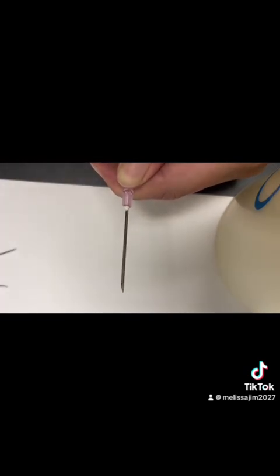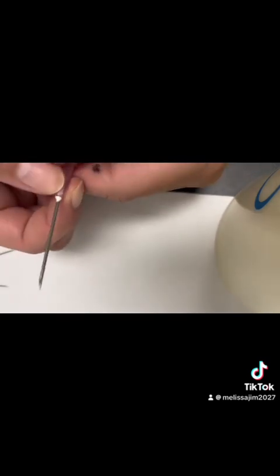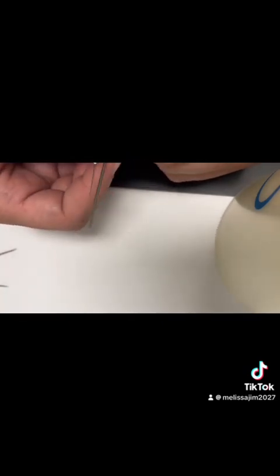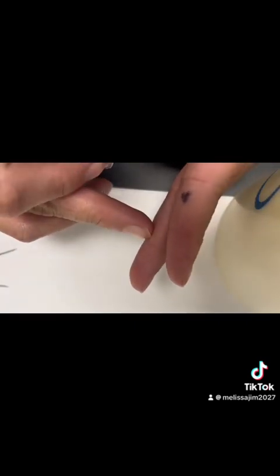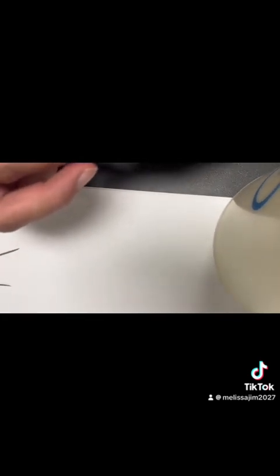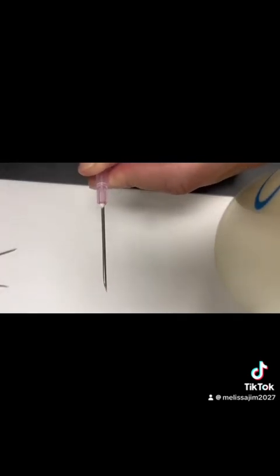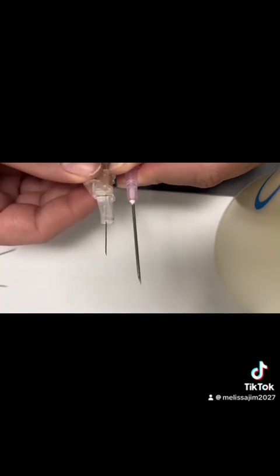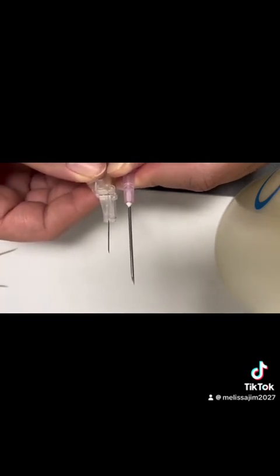And again, how you're going to know which type or which size needle to select is going to be based off the purpose of the injection. So why are you giving it? Are you giving it for an IM? Are you giving it subcutaneous, intradermal? And we're also going to base it off the size of our patient. If we're giving an IM injection, we would choose different sizes, say for like a John Cena sized man, maybe I would use this size. But if I was going to give it to a little baby IM, I would select this 25 gauge needle.